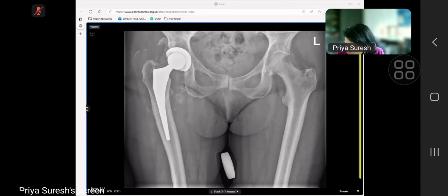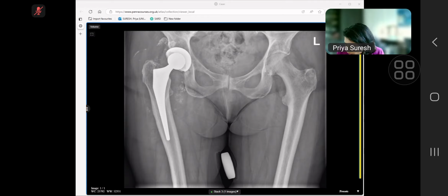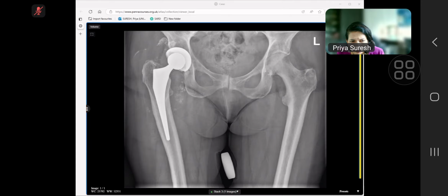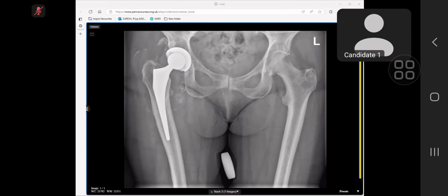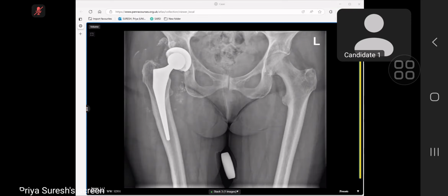So what aggressive process are you thinking about? There can be development of a sarcomatous lesion. Do you think it is arising from the bone or from the soft tissue? It is mostly in the soft tissues, basically soft tissue calcifications and opacity around the joint. Bones are unremarkable except for the degenerative changes. So you think it is a soft tissue sarcoma that you're looking at? Maybe, it can be.